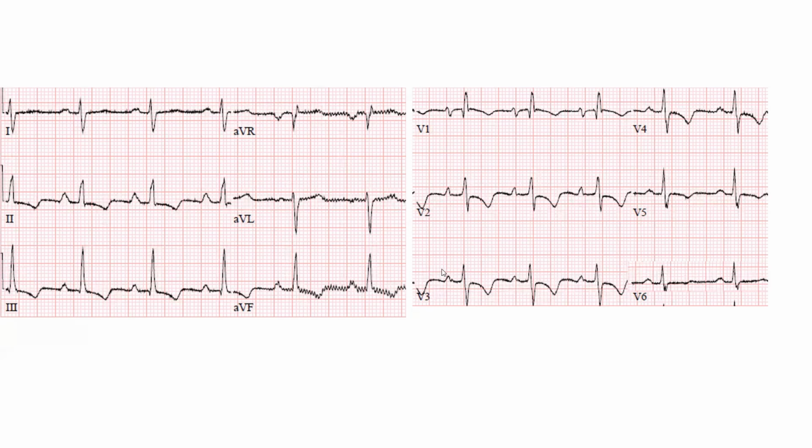And the reason I'm showing this is that you need to recognize that specific QR pattern of RVH, which I will explain. Another finding on this EKG is you do have definitely right atrial enlargement. The P wave in lead 2 is still over 2.5 millimeters in height. It doesn't quite make the cutoff in lead V1 where the positivity should be more than 1.5 millimeters. You do have a feature of left atrial enlargement. It's deeper than 1 millimeter and wide 1 millimeter. So you have biatrial enlargement. You also have something else suggestive of left atrial enlargement, that prolonged, somewhat notched P. Usually you would see it in lead 2, but you see it here in lead 1.